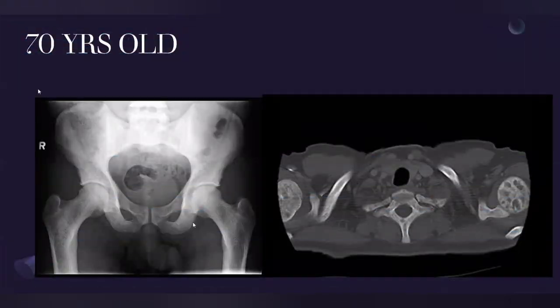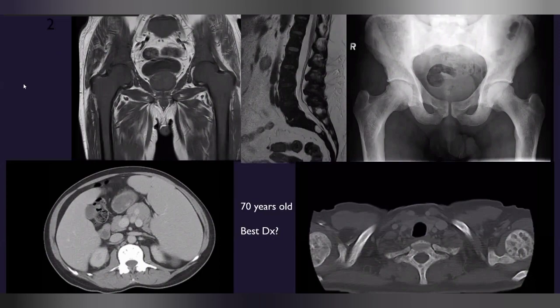These are just increased sclerosis in the humeral head; basically all the bones are very increased in density, and there are subchondral cystic changes in the humeral head. So again, avascular necrosis, but this is a 70-year-old. The other patient was young, right? So similar increased bone density and avascular necrosis and diffuse replacement of the bone marrow with splenomegaly, in a 70-year-old. So this becomes a diagnosis of myelofibrosis.